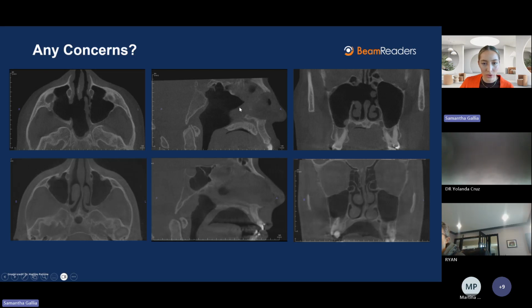We can also appreciate in our sagittal view an extension into this typically bony area here, where we have our brain up here in the soft tissue region. Whereas in the lower image, we can appreciate the continuity of the sella turcica. So we definitely have a lesion happening here. I think it's pretty helpful to be able to compare it to the more normal scan and actually see where our bony borders are missing.